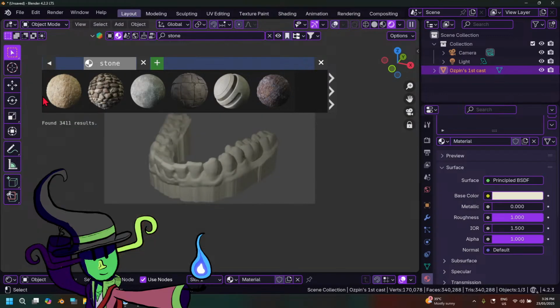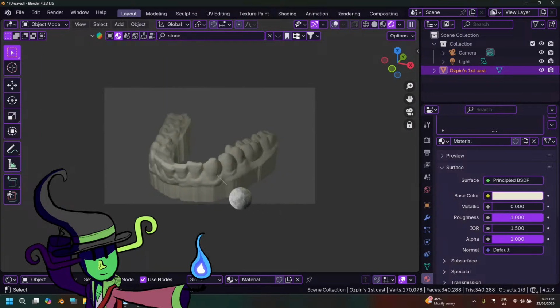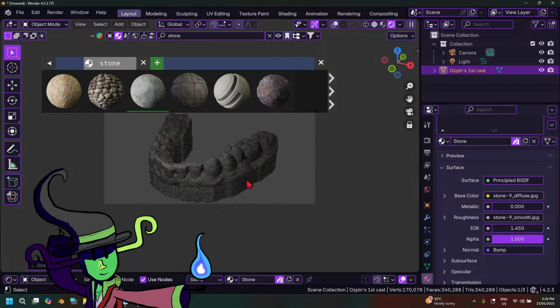Yeah, I think this is good. Oh my god, this is like a festival coming out of my house right now. Anyway, I'm gonna just click on this. Let's see if this could change it into something. Wow, look at that.